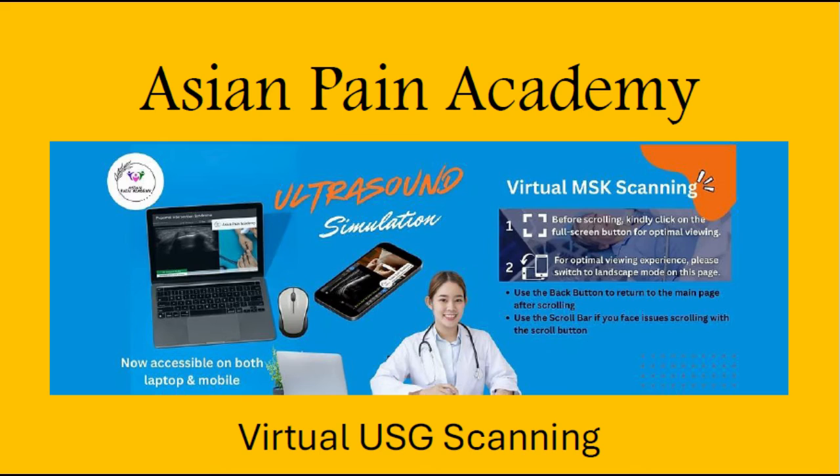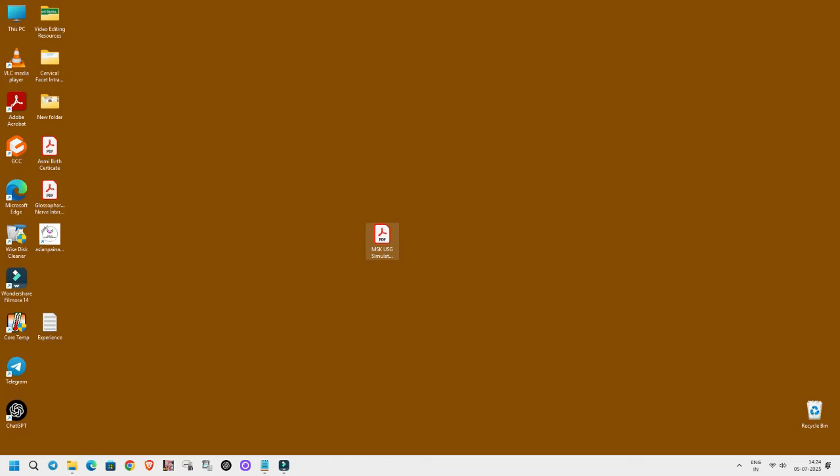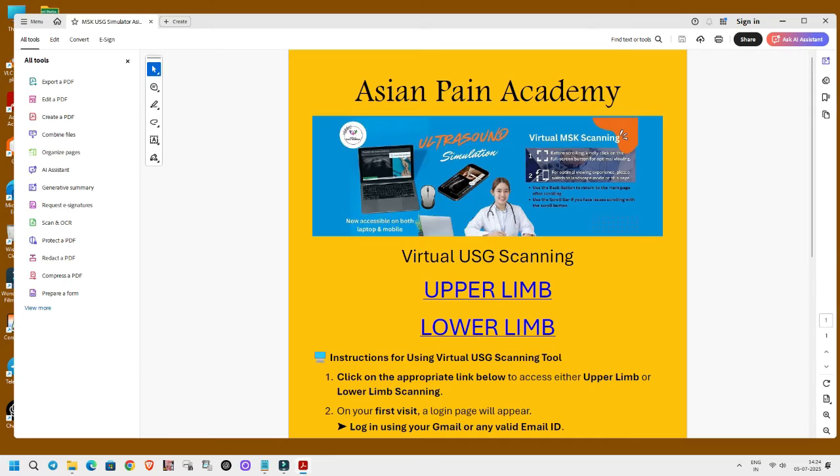Welcome to the Scroll-Based USG Simulator, your interactive tool for mastering ultrasound anatomy. Here's how to get started.